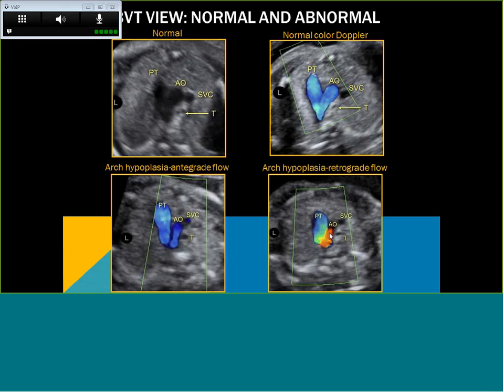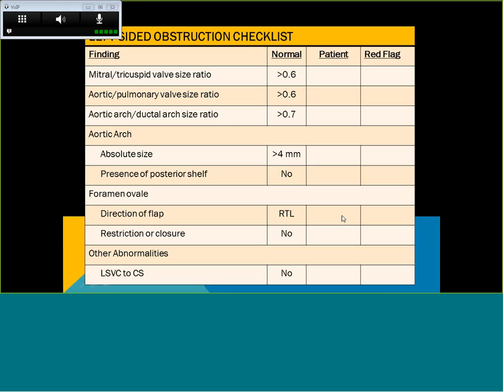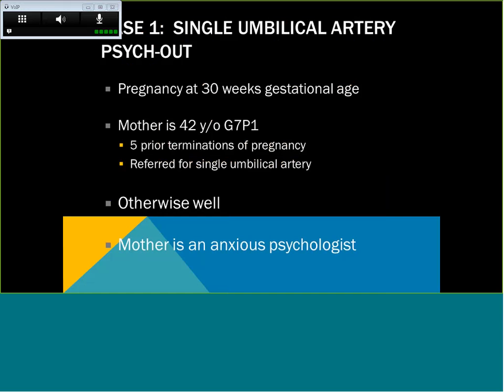There might be no anterograde flow, but flow into the very hypoplastic ascending aorta and transverse arch is all going to be retrograde. Yeah, so this is that typical picture, and I will show some examples. So again, this is kind of our checklist that we can then go ahead and use as we go forward and review some of these cases here.